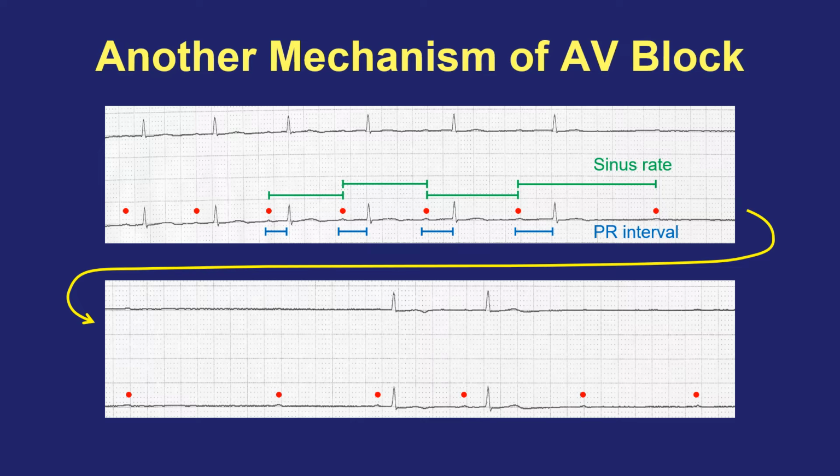You don't always see this. Sometimes you can see just sinus slowing or sinus pause, or just AV block with very little change in the sinus node. That can be a little bit harder to diagnose, but when you see both happening simultaneously, you should very strongly consider a vasovagal etiology. These are usually self-limited, usually do not require long-term treatment, although in patients who are intubated or have had a neck injury or an abdominal process, something that's causing repeated episodes, sometimes temporary pacing or sometimes even permanent pacing is required. But again, each individual event is usually self-limited and not life-threatening.